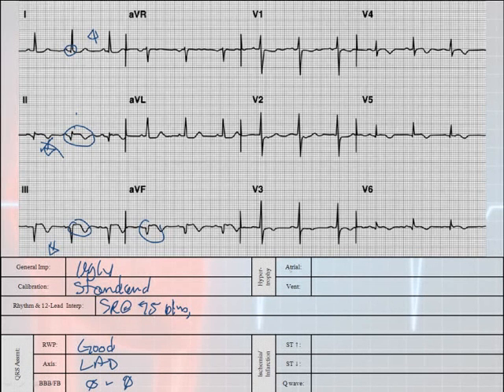Do I have any atrial enlargement? If you look at leads 1 and/or 2 and/or 3, it doesn't look like there is any humping or any peaking, so I'm going to say no on the atrial enlargement. Ventricular, it looks like V2 might have, I'd have to do the counting here, that looks to be about 11. That looks to be about 12, so it looks like it is just 1 millimeter further down than it is up. So there's no right ventricular hypertrophy, and there's no left ventricular hypertrophy either.